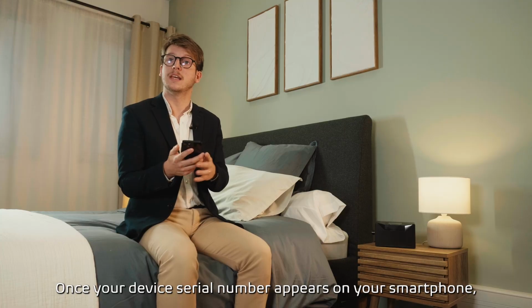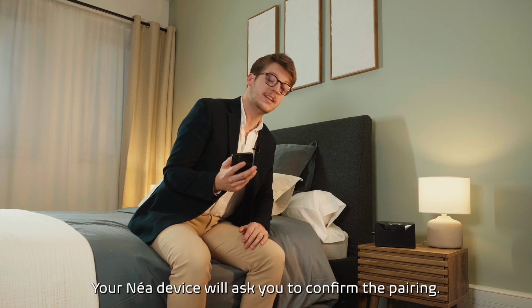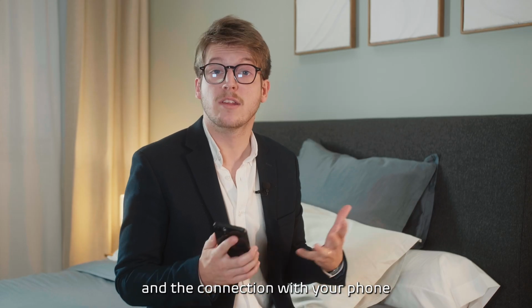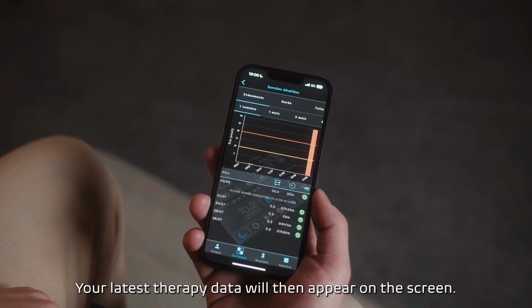Once your device serial number appears on your smartphone, tap on it. Your NEA device will ask you to confirm the pairing, press confirm, and the connection with your phone will be established instantly. Your latest therapy data will then appear on the screen.